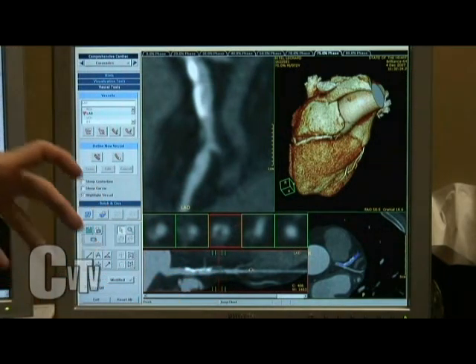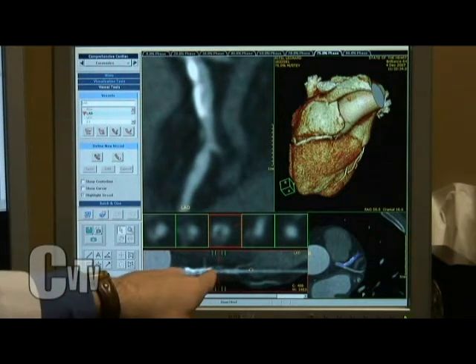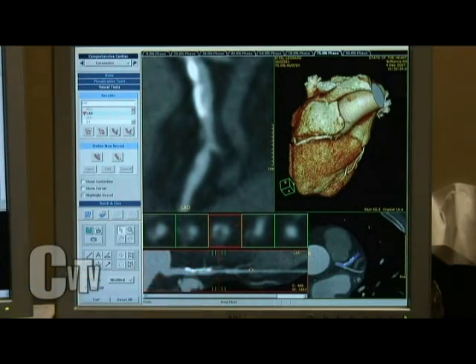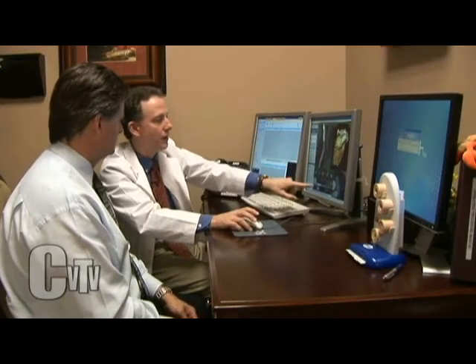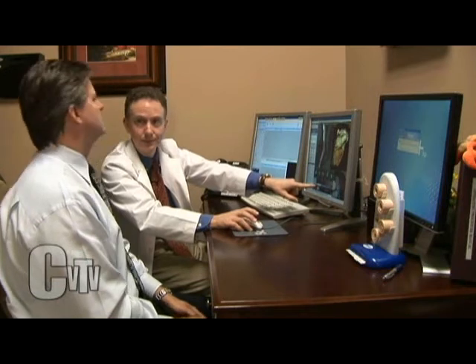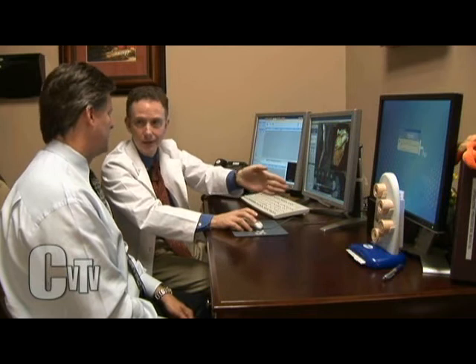So we're actually seeing an expansion of that plaque going outward at this point. That's why this person has no symptoms, no chest pain, and had a normal stress test. In fact, the first time we met this gentleman, we did the first scan, this plaque was much worse. So you've actually regressed the plaque. You've made the plaque better. This is now 18 months later.